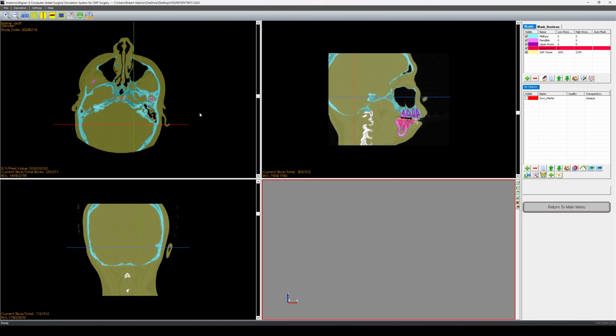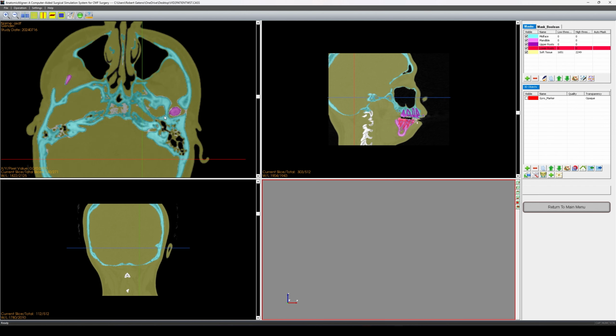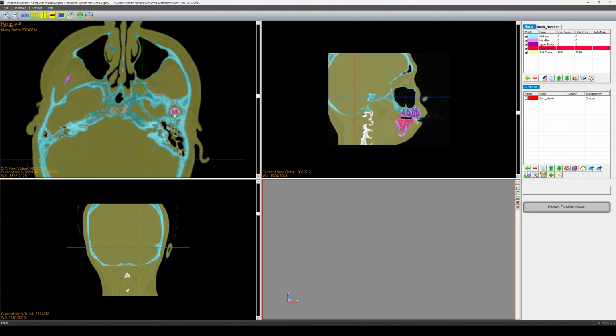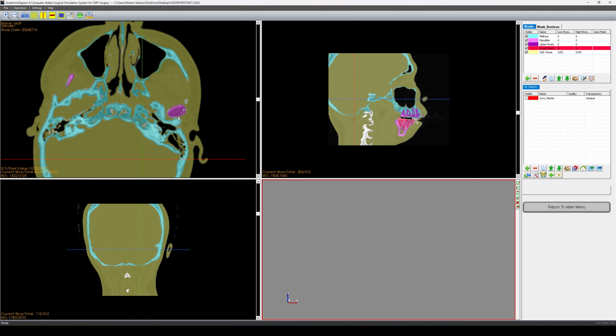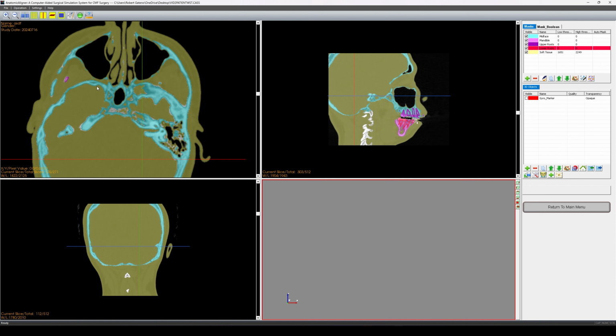Let's go through an example here together by cleaning up our midface and mandible. I find it best to do this in the axial view as we get a top-down approach to this. If we look over here where our mandible starts, we can start to see some of that cyan attached to our mandible, and we don't want our midface and our mandible to be fused together when generating that 3D object. That would be bad. So let's start at the top slice of this issue, which appears to be here.